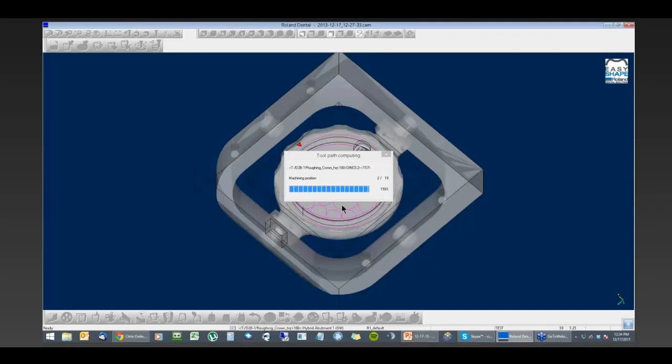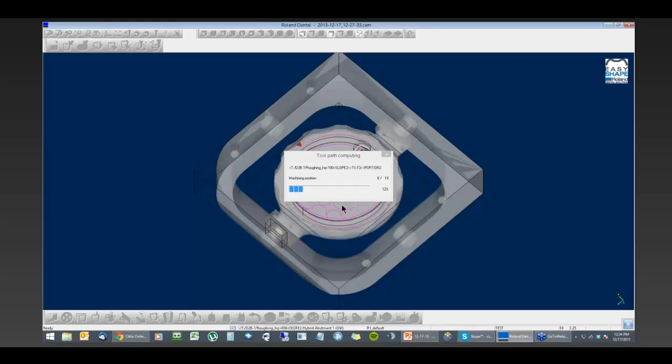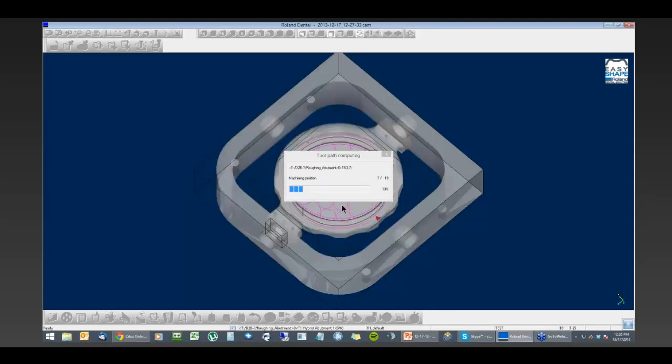Whenever you're milling a new object type in SUM3D, something that you've never milled before, especially if you're not sure that your reseller has provided it to you, what I would do after your calculation, instead of sending it directly to the machine, is say no when you get that option, and then run through the simulation to make sure that it's cutting out correctly. This should be the general workflow whenever you're milling anything new, just to give it a check. Certainly it doesn't hurt to simulate after every run, but of course, in some production environments, we all know that may not necessarily be possible.